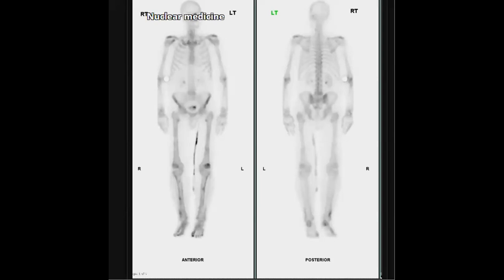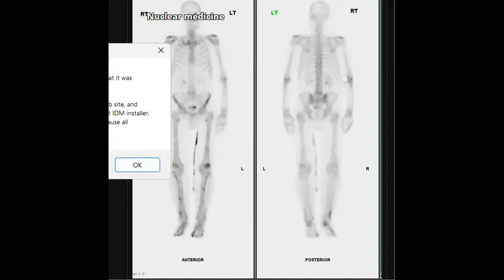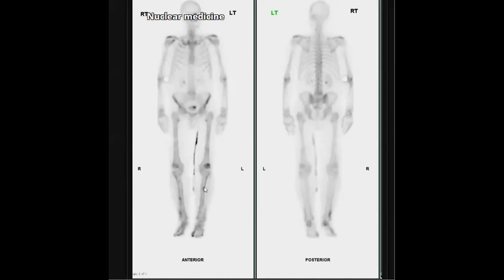This is a catheter, yes. Sometimes there's some artifact, maybe some bags, some catheters in the study. So take it easy. Sometimes you can find the injection site. Okay. The main finding here is the uptake along the cortices of the long bones. In such a case, everyone will be happy if you say that you will correlate with X-ray.